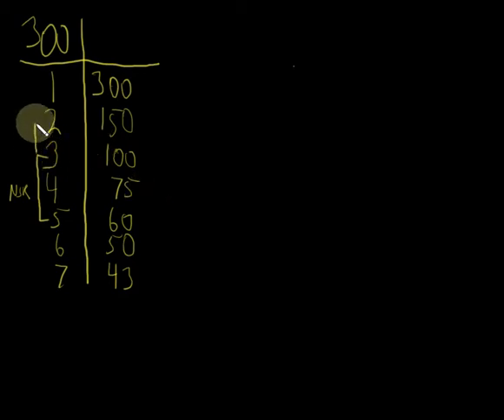If I come up here and it's between 100 and 150, this is sinus tach. And you're going to learn this one here in class next time, atrial tach. Atrial tachycardia is if the heart rate's up over 150.